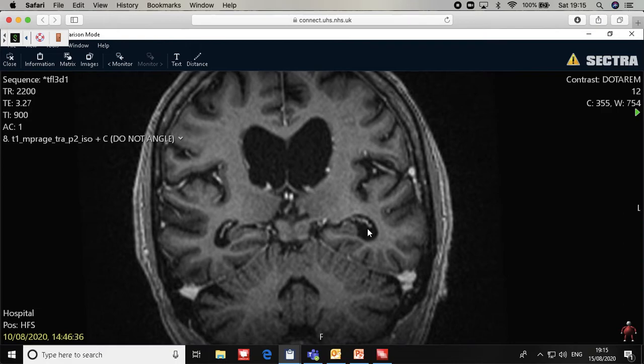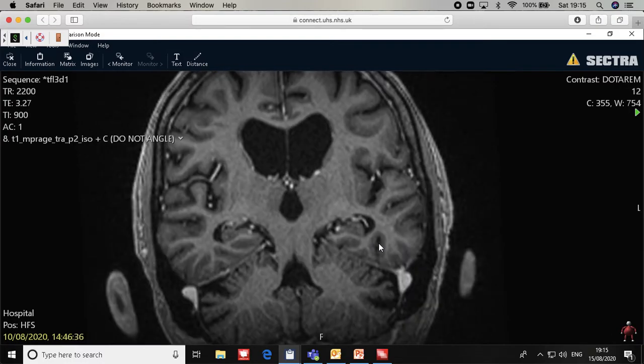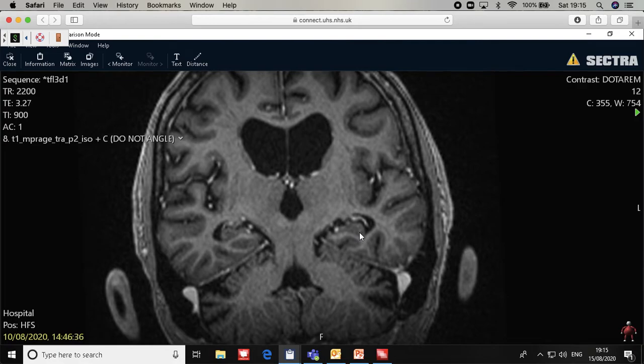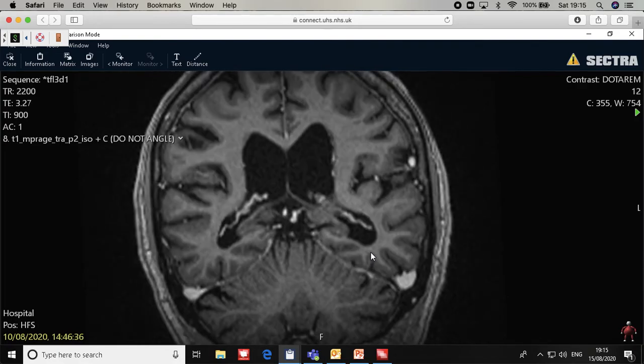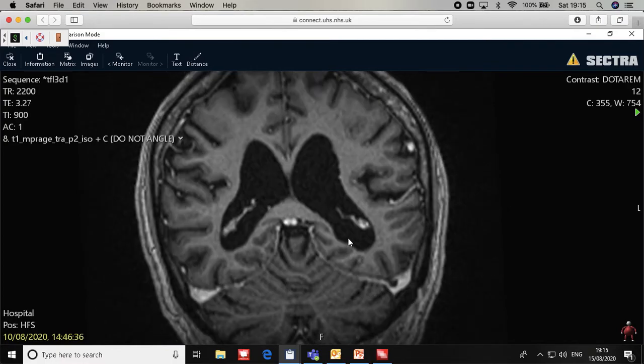Yeah, you can see something in the gray matter on the floor of the lateral ventricle temporal horn, and this will be your hippocampus. And if you go anterior, this will be the amygdala. Where is the amygdala now?